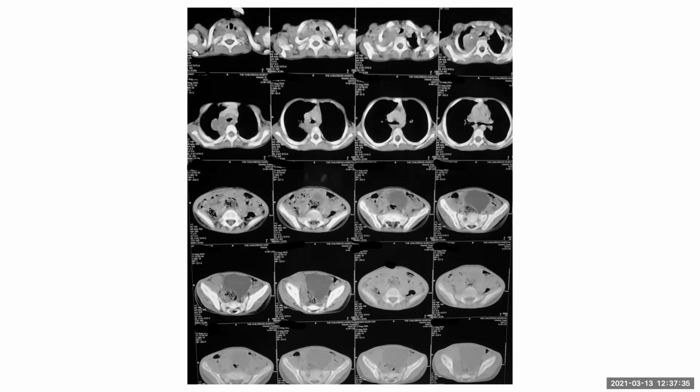It extends along the paravertebral region, ending just above the level of the carina. I'm looking for any intraspinal extension, which I'm not able to appreciate on these images. Coming to the abdominal sections, the bladder appears distended.